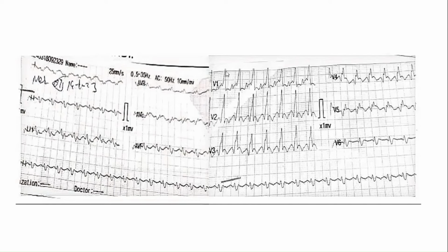So do you think it's a bizarre intrinsic deflection? We call this intrinsic deflection from here to the peak. So do you think it's pretty bizarre or pretty sharp? What do you think? Pretty bizarre. Okay. Next in V6 I can see a mild deflection down, but more of an R wave is there. Okay. Next point, please.